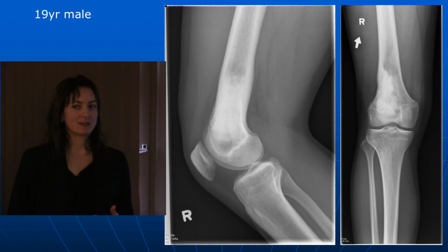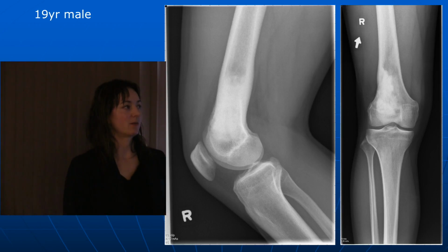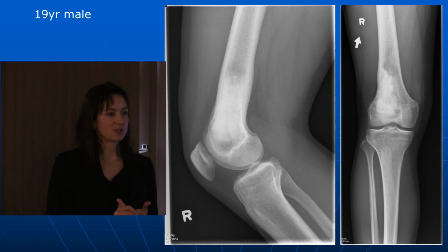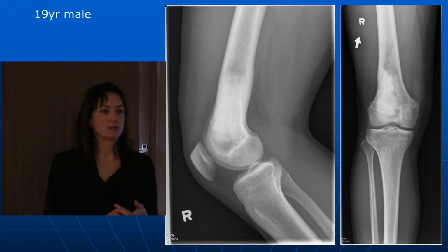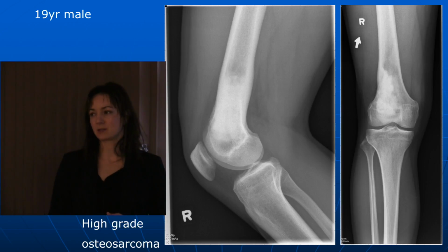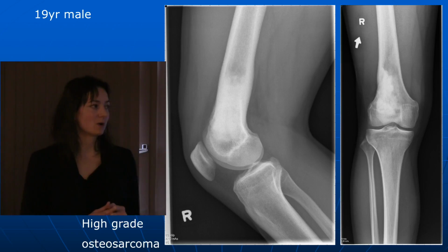So there are two really horrible primary sarcomas in young patients. We've seen Ewing's sarcoma. Neuroblastoma doesn't look like this, and it's much younger children. We're talking about 4, 5, up to 10. So this is old adolescent, young adult osteosarcoma. So this is a tumour from the bone that forms bone. So this is osteosarcoma. So for me, this is nothing but osteosarcoma.